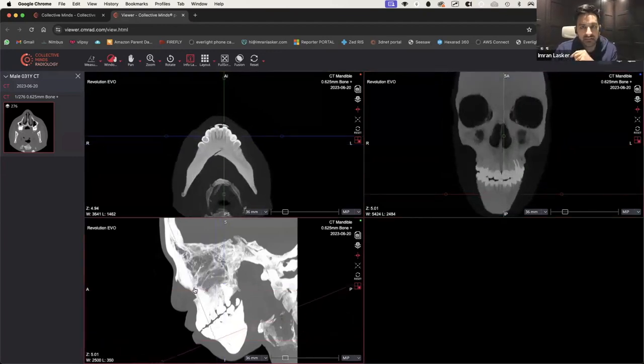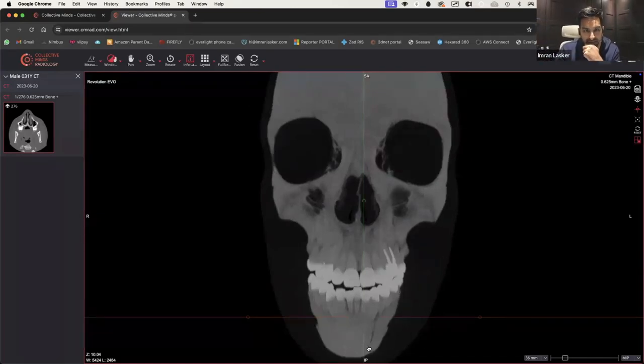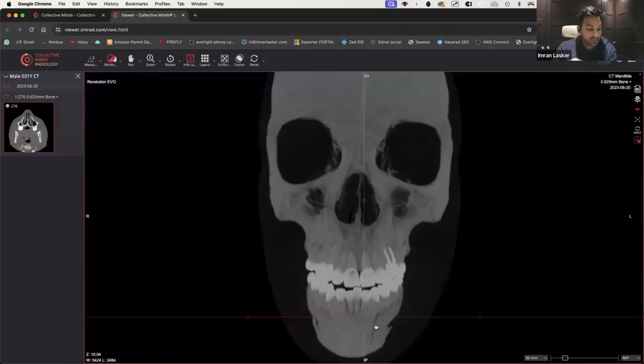So I genuinely think this is a really good way to spot fractures. And look, can you see, I'm like Macbeth, I'm holding that skull in my hand. And can you see that straight away? Yeah, there is this linear abnormality located right in that sort of middle aspect of the mandible, right?